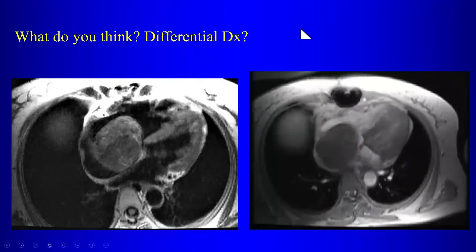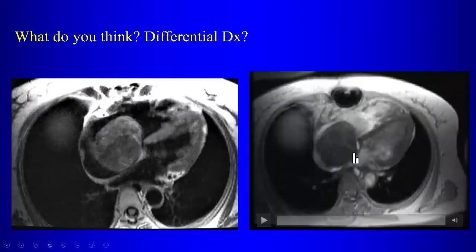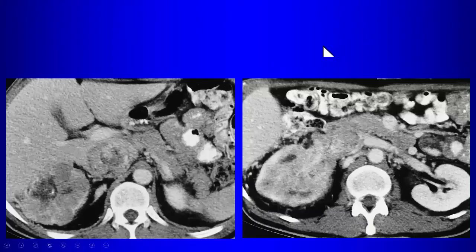Well, let me show you another interesting image on the same patient. So, right, so this is a renal cancer. So this patient has a large renal tumor here that is invading what structure? The inferior vena cava, right. So when we have a large filling defect like this in the right atrium, the first thing to consider is, is this a mass growing up the inferior vena cava into the right atrium? And the most common tumor to do that is renal cell carcinoma. Okay? So that can invade the IVC and grow up into the right atrium, which was the case here.